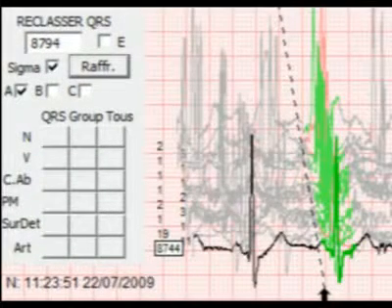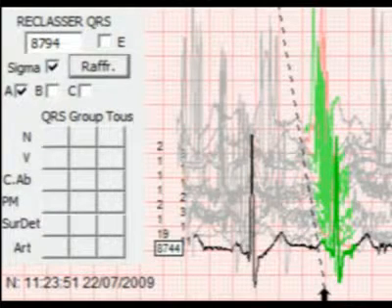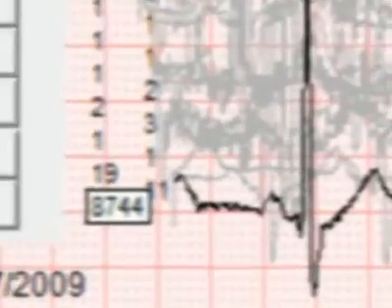When this option is selected, click Refresh to update the graphic. Each line compiles all the QRS with a similar template, which can be accessed with the right arrow button on the keyboard. To use this context, the displayed QRS are copied in the first sample of the list. The number of QRS in each line is shown on the left. The different figures are in staggered rows to be legible.